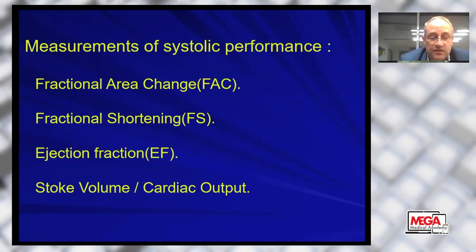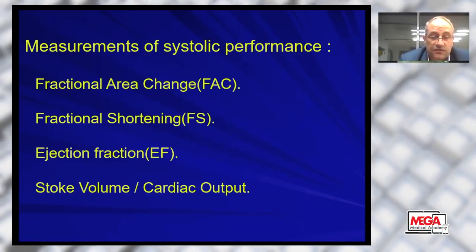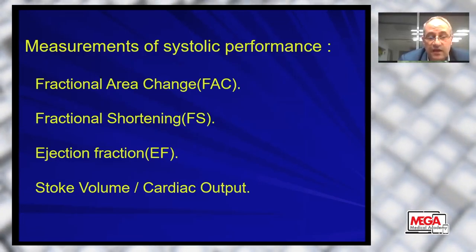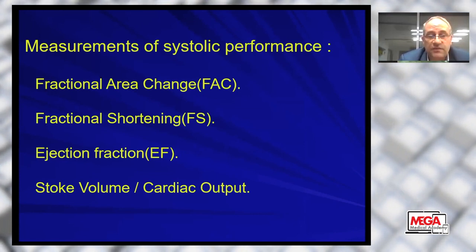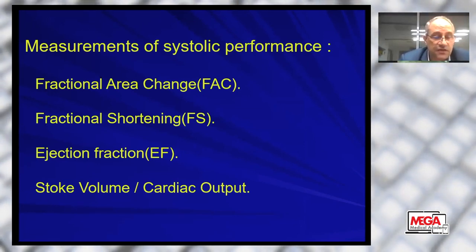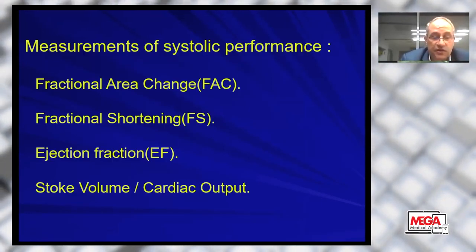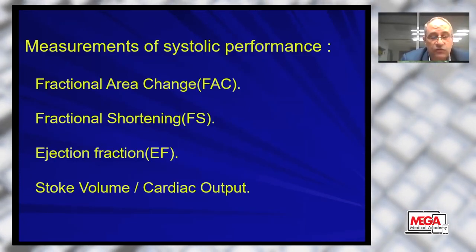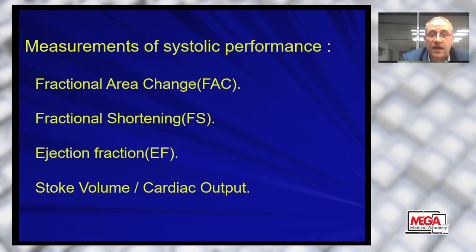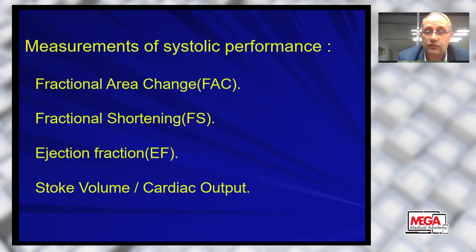We rapidly discussed hemodynamic measurements. We discussed first Doppler principles. Then we discussed the three main formulas for hemodynamic calculation. Then we discussed how to use end-diastolic diameter to detect the function and the cardiac output, how to use the area to detect the function, how to measure the volume, and to use the volume to detect the function, either ejection fraction or cardiac output.